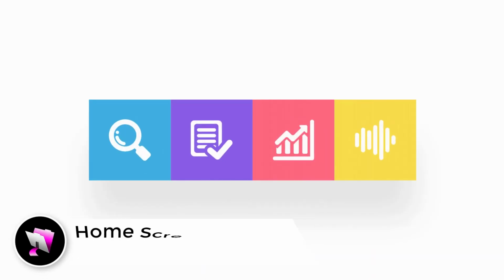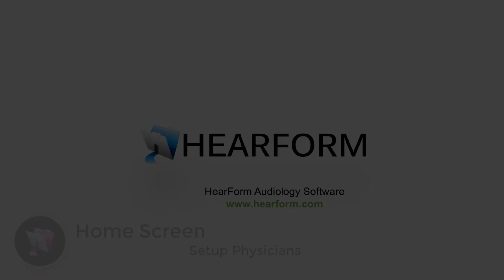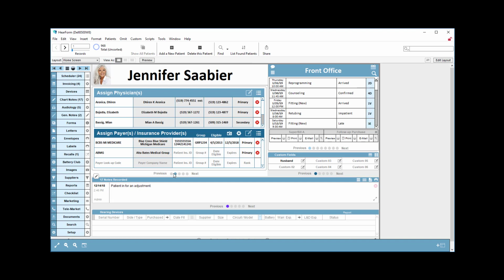Welcome back. This video will explain how to set up your physicians in HearForm Pro. From the HearForm home screen, let's click the second dot, and you see here the assigned physicians, assigned payers. We're going to set up our physicians so that they show up in this drop-down list of choices here.